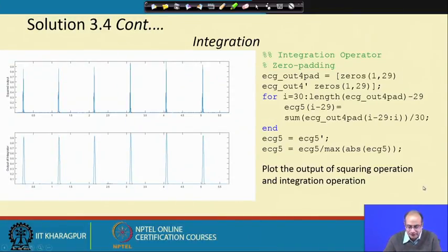Now, what were those jagged peaks have now merged, giving a clean single peak for each QRS complex. So, that is what we were looking for, that we can unambiguously get the location of the QRS complex, and that we get by using the MA filter.